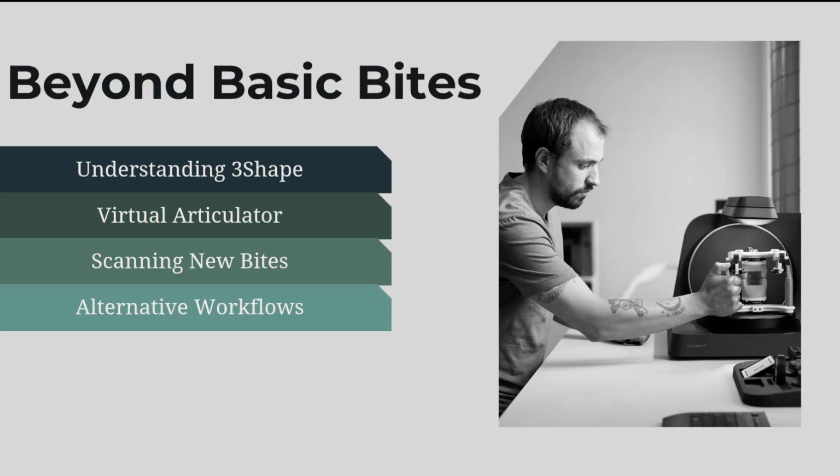So some of the things that we spoke to were understanding how 3Shape works and some tips on the bites, using the virtual articulator, keeping in mind this is not using the 2024 update, scanning in new bites, and some alternative workflows for scanning in new bites.